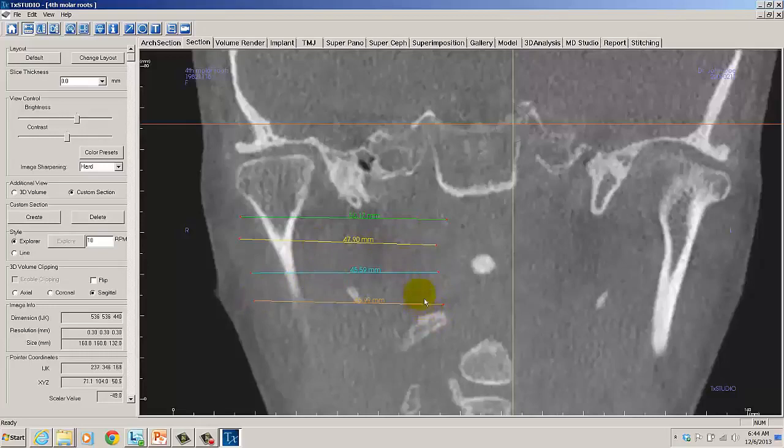You can see with each measurement that I've drawn, it's changed colors, the corresponding text as well as the line. This will recycle the colors through 4, and then it'll start again and go through the process again of changing the colors as well as the line and the text. And this is nice because if we do multiple line measurements fairly close together, if the measurement is the same color, then it's easy to get maybe that separated from the measurement line.